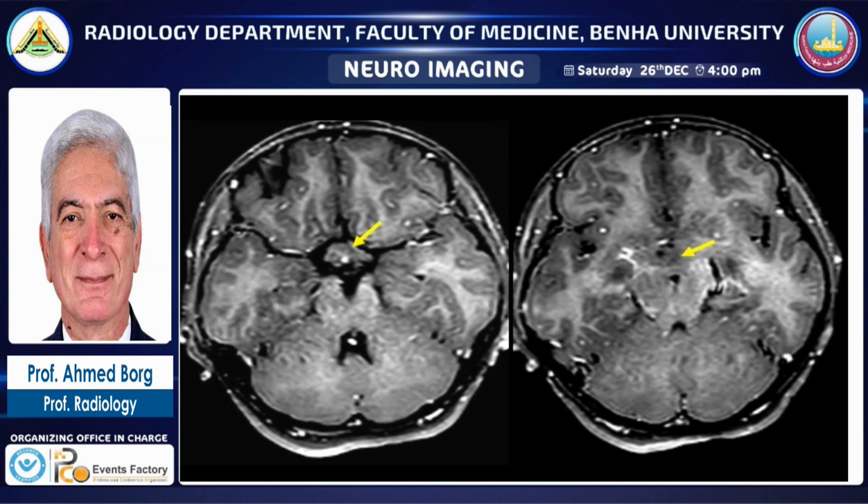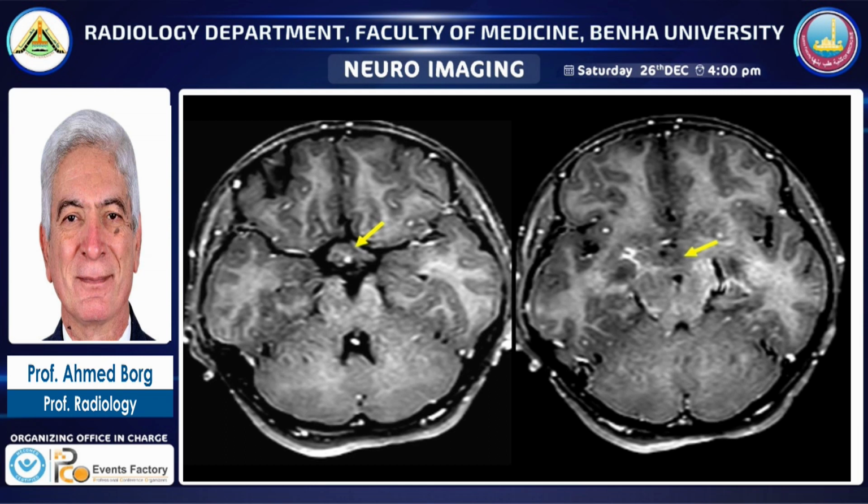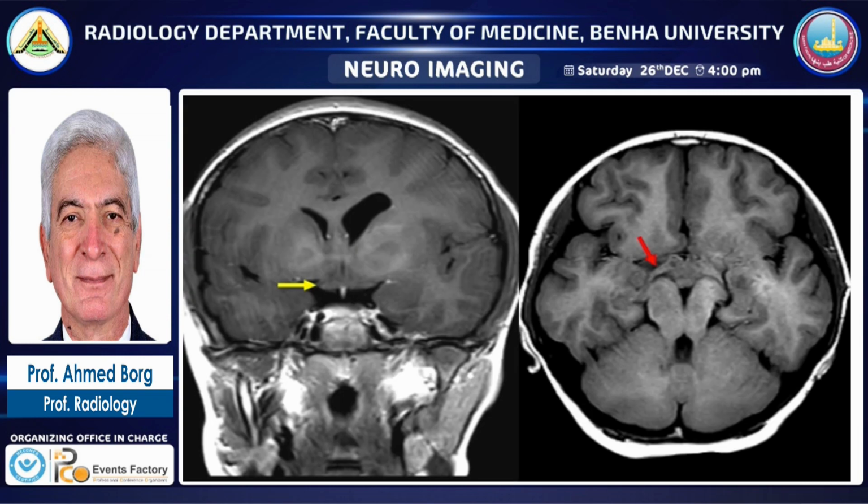There's enlarged optic chiasm, infundibulum of the pituitary stalk. So this is enlarged optic chiasm with no enhancement, or minimal enhancement here in the optic chiasm.